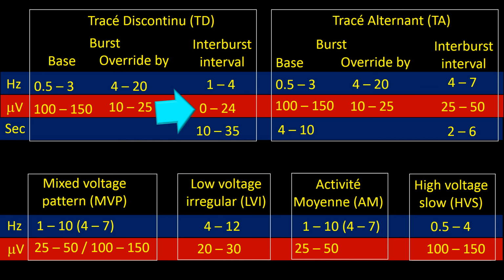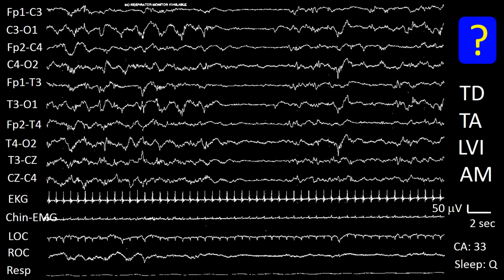Since the interburst interval amplitude is less than 24 microvolts, the best answer for this question is tracé discontinu.